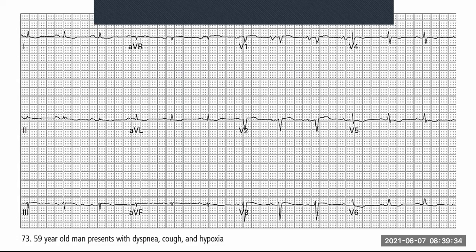All right. Pericarditis. So pericarditis is an inflammation. It does lead to changes, but we've discussed it before. It doesn't generally lead to small QRS complexes, right? And then the last part is our T waves. How do our T waves look?